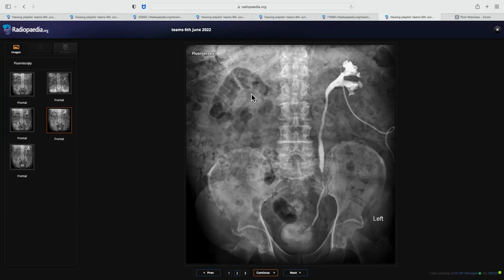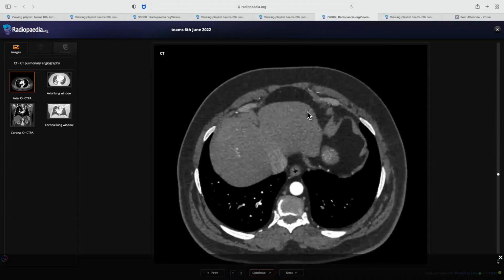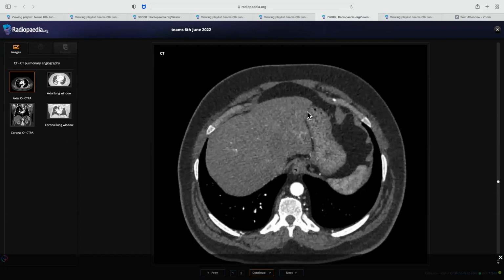So as you now know, there is no abnormality on the right side at all because it's a nephrostogram on the left side, and that's why it's appearing like that. And there is a filling defect in the mid ureter because there is a calculus there which is causing upstream dilatation. So the main purpose of showing this was the nephrostogram only. And on the pulmonary embolism case, of course, very well done. And you told about the emergency thing, which was very important. You immediately highlighted the emergency part, which they expect.